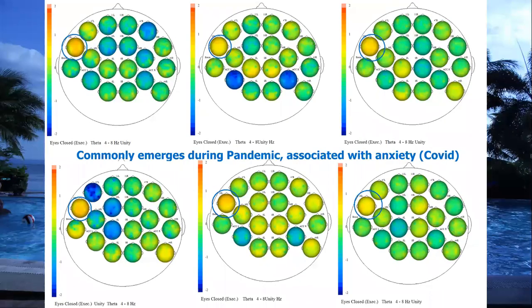Look at this. This is actually adults. This is six individuals. Most adults are showing this marker who are recorded during COVID. We don't see it that prominent. We see it in maybe a quarter of the people because we have a lot of anxiety cases, but we're getting it in about 3/4 now. The kids aren't showing it, but the adults are showing it when we do a brain map during this period. You see it's just showing up, even when everything else is normal.